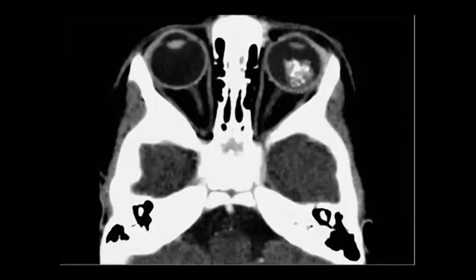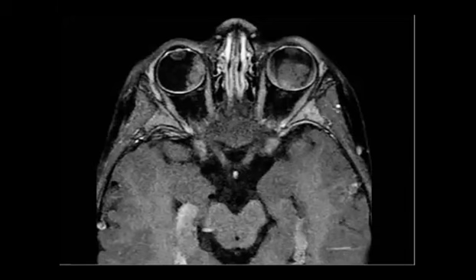So retinoblastoma, why? Because any calcified lesion in the eye globe will be retinoblastoma. Shayma, I see some of our stars. Fauzi is present. Abbas and Hassan and others are absent today, but okay. I wish everyone is fine. So retinoblastoma will be one of the good differentials.